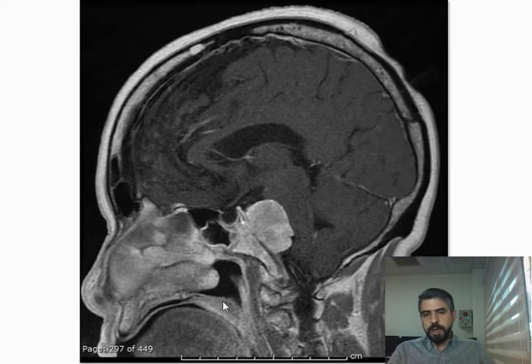This is another case of clivus meningioma. You can see it's based on the clivus, and obviously it's an extra-axial tumor that's showing dense post-contrast enhancement.